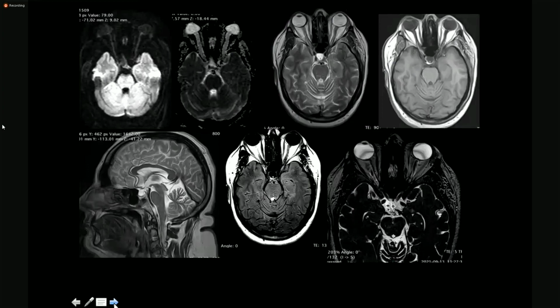Do you agree? Ma'am, there's a hyperintense focus. It is basically an empty sella, and the hyperintense focus which you are looking at is the infundibulum, and it is giving altered signals. It is insignificant. Just don't focus on that. There is an empty sella. This is one finding. Find some more areas.